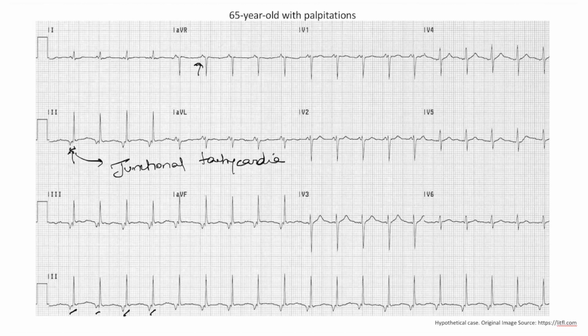If it were atrial tachycardia, you would expect the PR interval to be slightly longer. At this point, understand that EKG would not reliably and consistently help you differentiate between every condition. We've already seen that it might be a challenge to differentiate AVRT from AVNRT. It might also be a challenge to differentiate between junctional tachycardia and AVNRT.